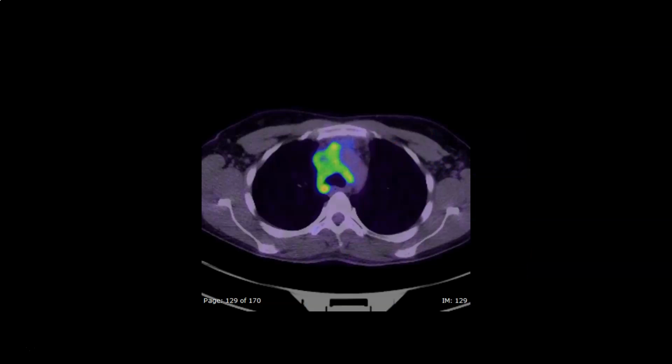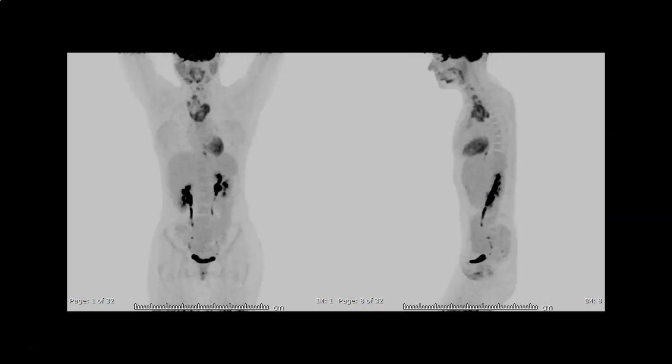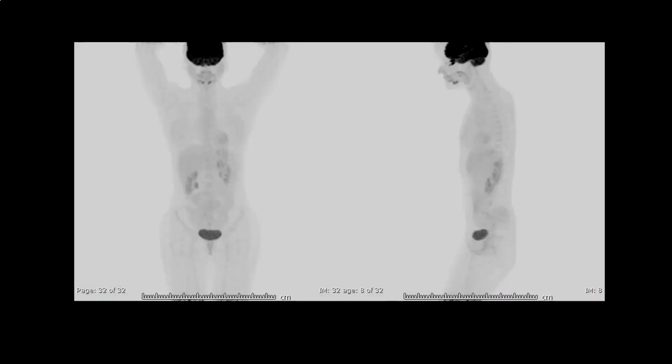The PET-CT offered a good baseline of the lesion's activity before treatment. Treatment with rituximab and steroids had a very good effect, evident by the absence of FDG uptake by the lesion after treatment. This is the positron emission tomography before treatment, and this is the positron emission tomography after treatment.